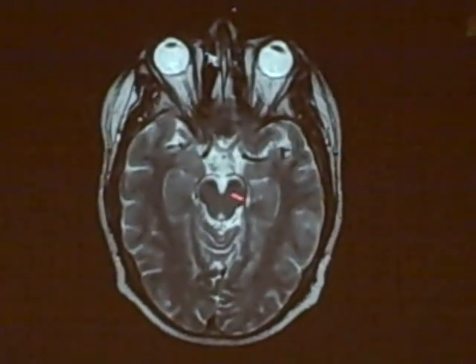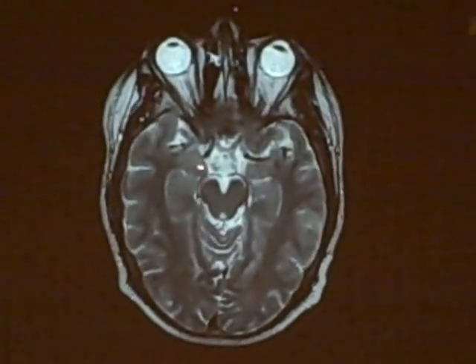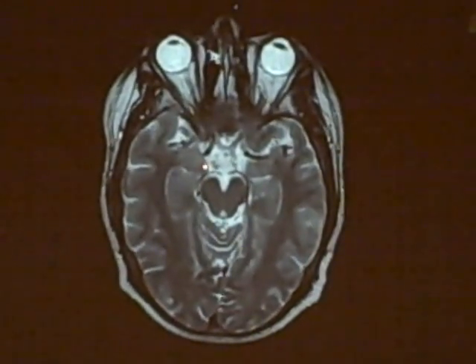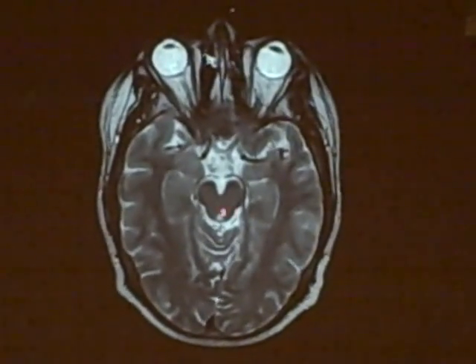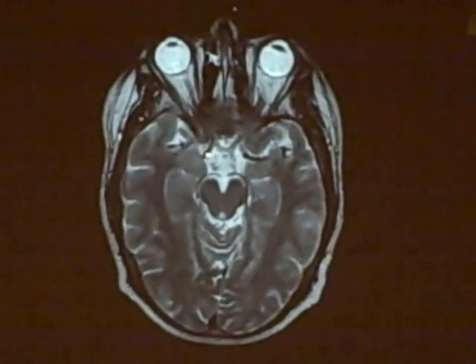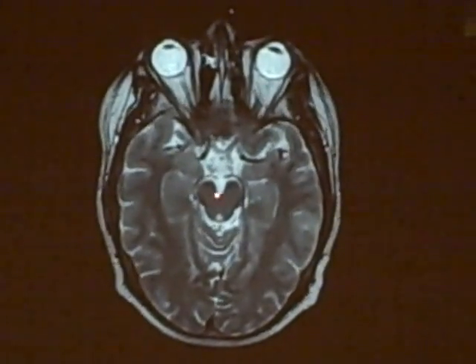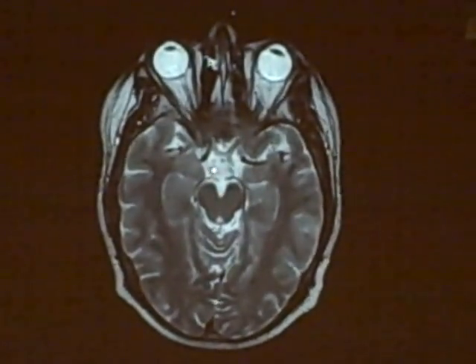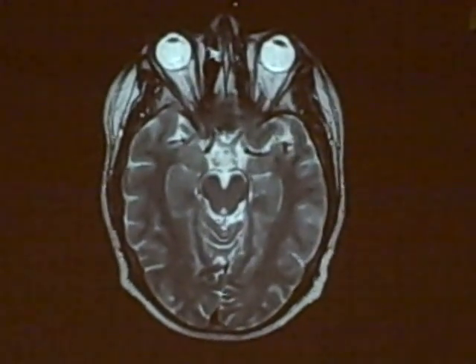Okay, so remember that the most medial part of the temporal lobe, which lies right next to the cerebral peduncle, is the uncus. Okay, so this is the uncus, and we've said the uncus compresses the third nerve if we have uncal herniation. So the third nerve comes out here in the interpeduncular fossa, and so that relationship with the uncus is really important.